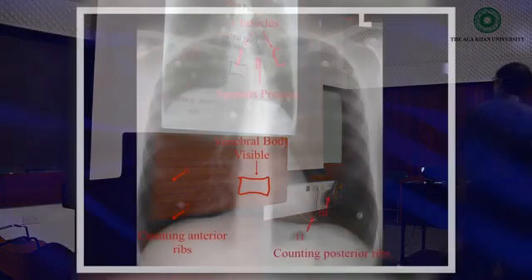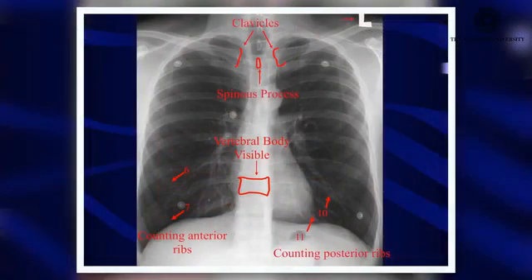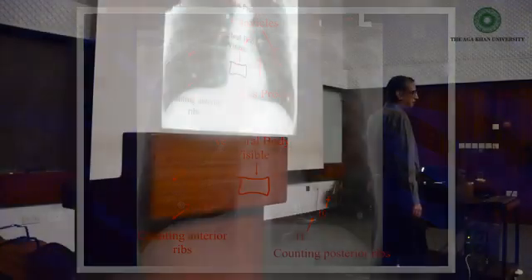And then, if someone asks whether it is a good inspiratory effort or not, you have to count the ribs. Let me count them once for you. Do you realize every rib has a posterior, lateral and anterior part? All these are posterior ribs, and all these are anterior ribs. Sloping downwards and inwards are the anterior ribs. Sloping outwards are the posterior ribs.